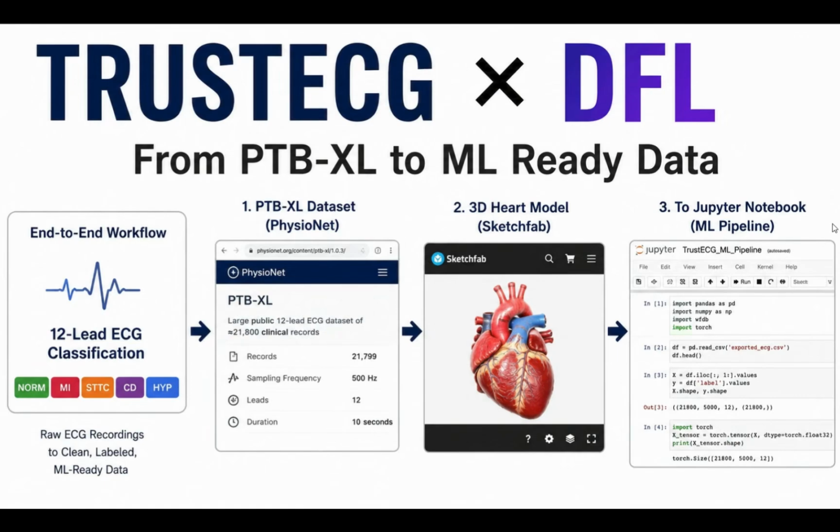Hey everyone, so today I want to walk you through something that changed how I work on my machine learning project. So I'm working on a project which is called Trust ECG. Basically what I'm trying to do is I'm building a model that looks at an ECG recording of someone's heart and tells you what's going on. Is it normal? Is there a heart attack happening? Is there some kind of blockage or conduction issue?